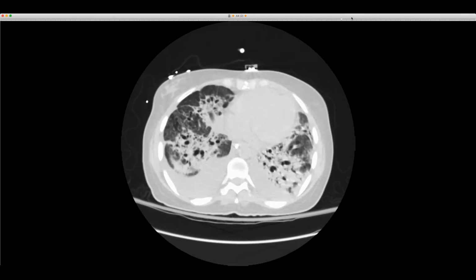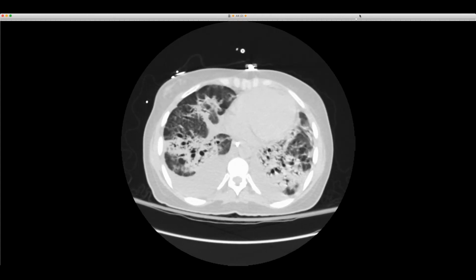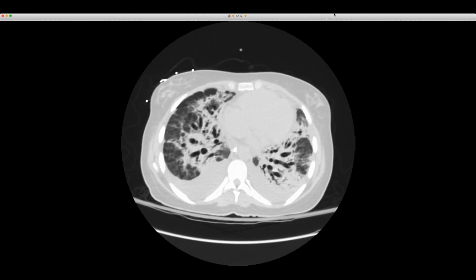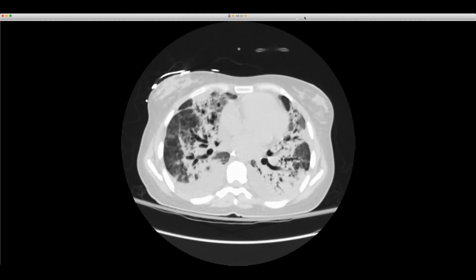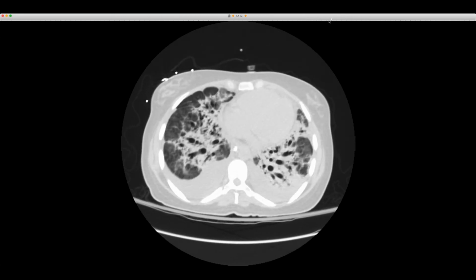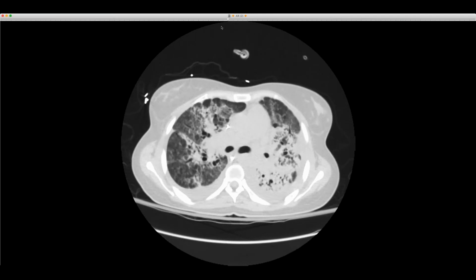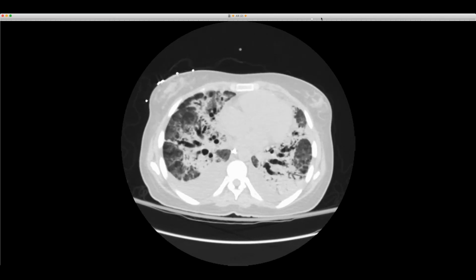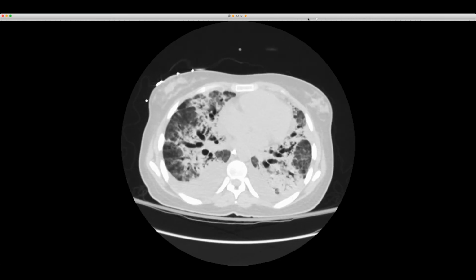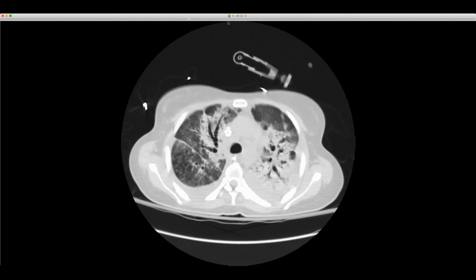I mean, but you're saying that you would not invoke ARDS in this setting? I would say post-infectious. I think the infection explains the eventual pattern of scarring, and I don't think you need to invoke ARDS, which implies to me that there's a more generalized response throughout the lung, not just in the areas of infection. Of course, infection leads to alveolar damage, but when the infection is cleared up, most of that lung really doesn't have this scarring pattern.